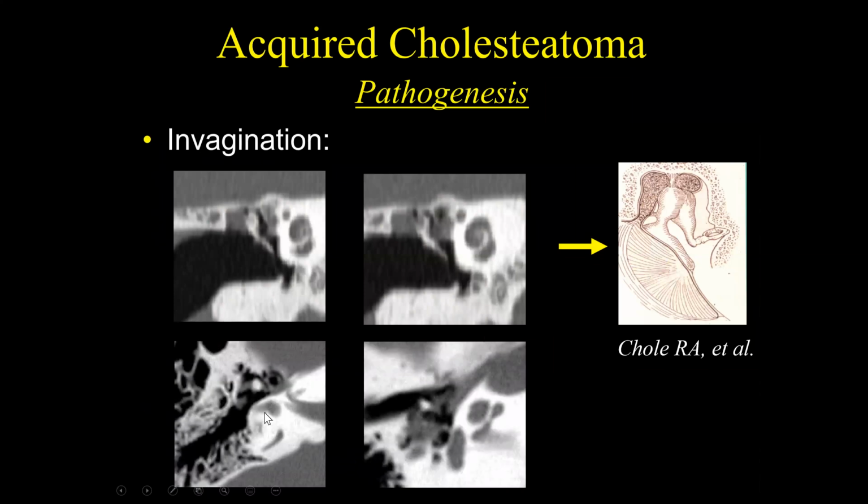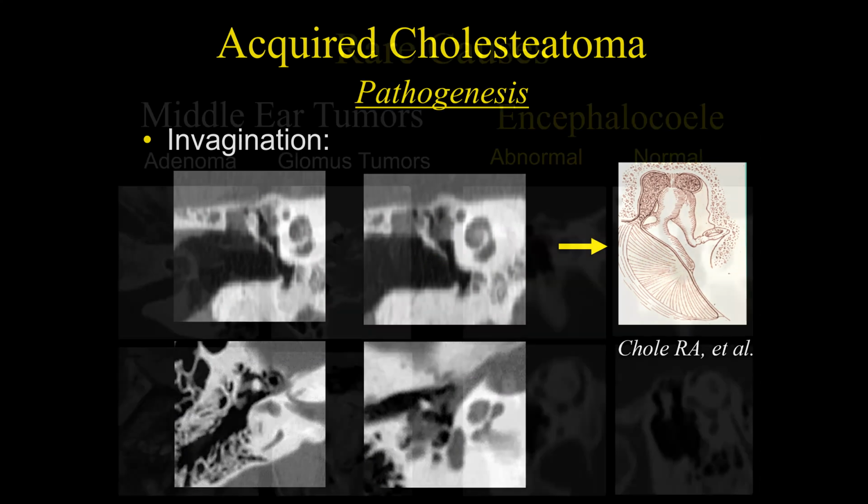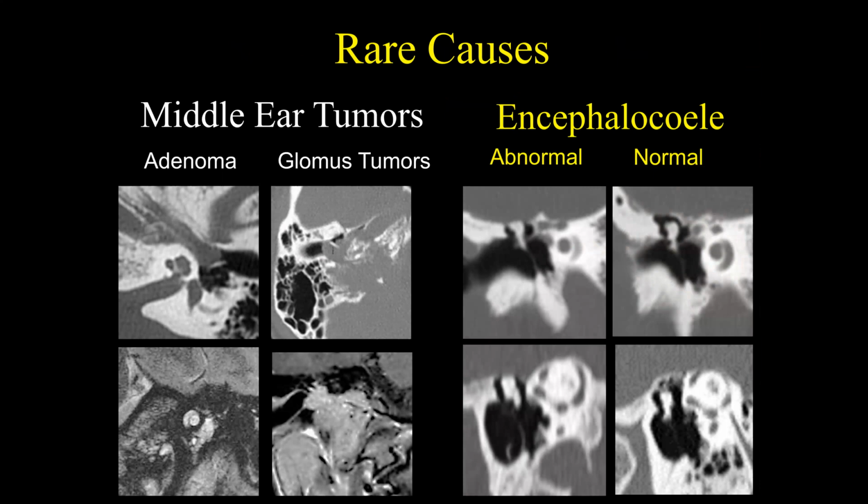In this particular case, another example of a cholesteatoma. Here we can see the malleus, we can see the manubrium of the malleus, but notice how there is no incus. So the short process of the incus here is absent. Once we get down to the middle ear cavity, we can see the anterior and posterior crura of the stapes. We can see this soft tissue mass right here that's eroding the long process of the incus, and we can see erosion of the capitulum of the stapes. So again, another example of a pathology of conductive hearing loss due to cholesteatoma.